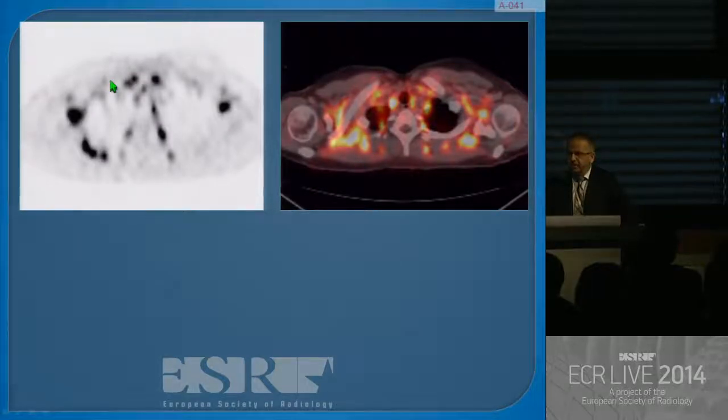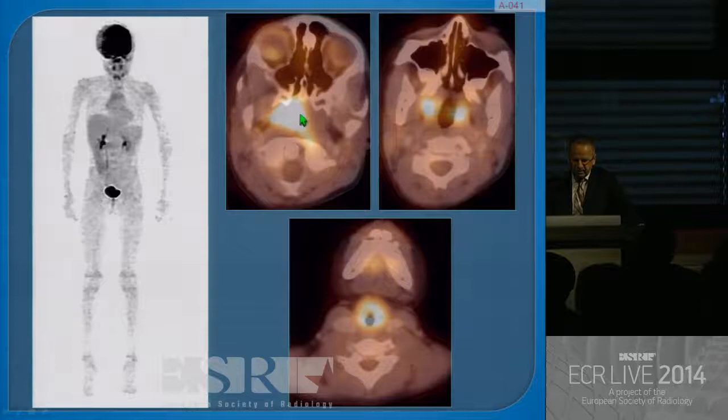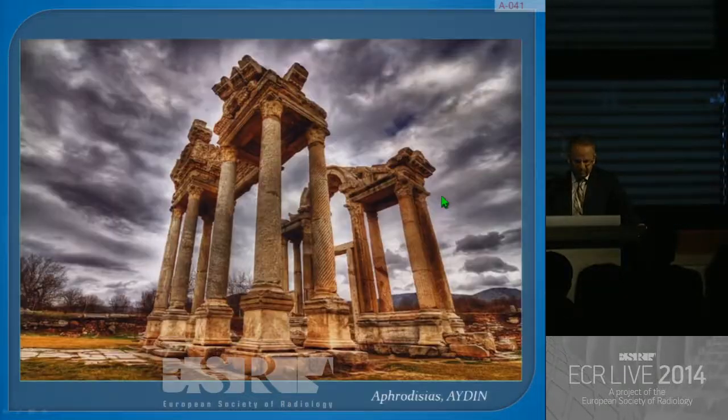There are many other well-known pseudolesions regarding PET CT. The brown fat can be mistaken for a mass, but the CT image can easily discard this mass suspicion. Lymphoid tissue may also look bright on PET CT images, as well as some normal salivary glands.